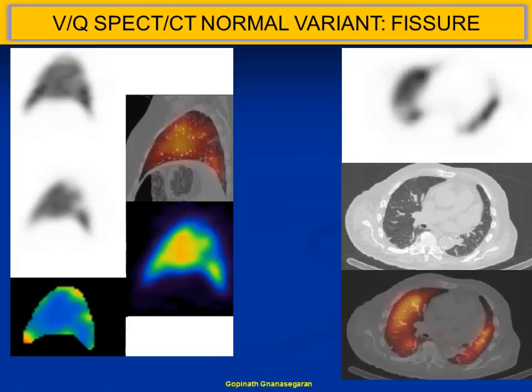But I'll come to this, there's the most challenging bit. This is the most tricky bit, why people over report on a SPECT. Some people will say planar imaging is much better than SPECT CTs. Sometimes I also do feel that I should have stuck to planar imaging, which was easier to say yes or no, because that's the normal ventilation. Okay, on the perfusion you are seeing a defect.